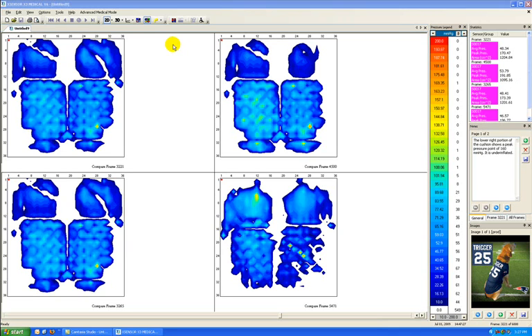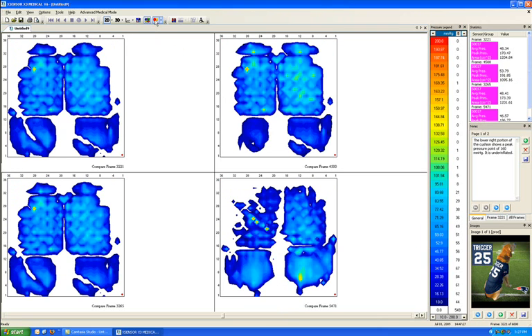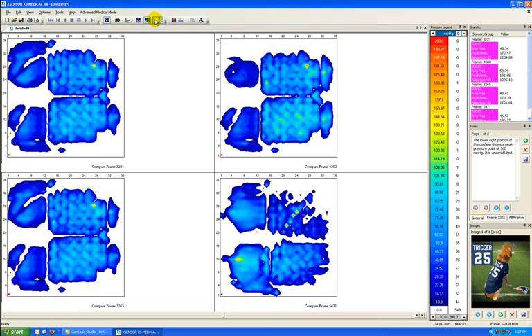In the top toolbar, to change the views, we can also rotate the appearance of the sensors. So looking next to the frame compare button, we see a yellow rotational arrow. If I click on that arrow, I'm able to rotate each of the sensors that I see on screen so as to optimize their position for my viewing. If I'm in 3D mode, especially the chair configuration mode, I can use the pull-down area to select between the active sensors. So in this case I recorded from a single sensor, but if there were 2 sensors attached, I'd be able to select one and then rotate it, but without rotating the other.